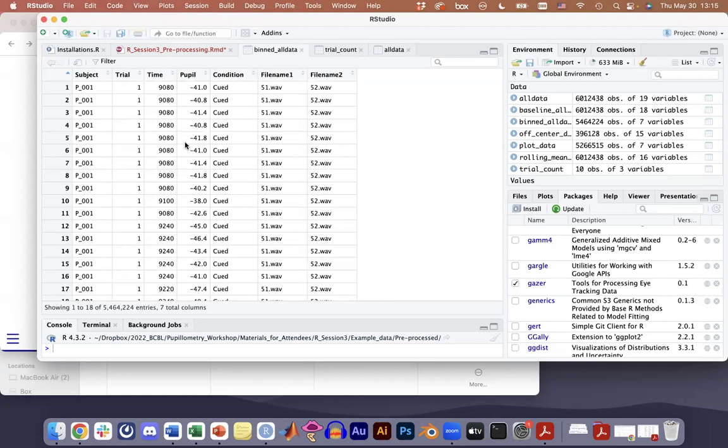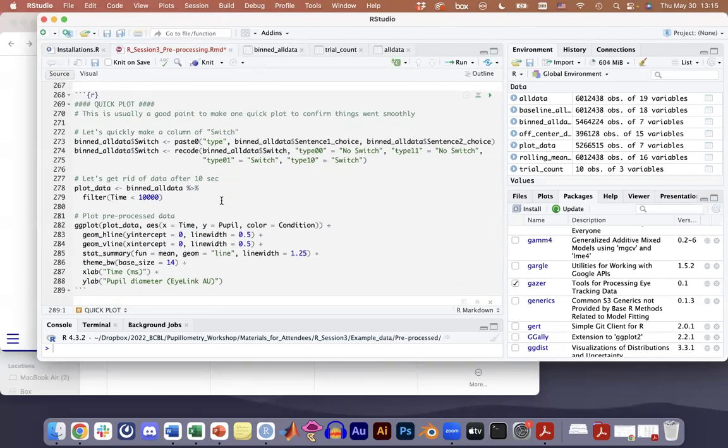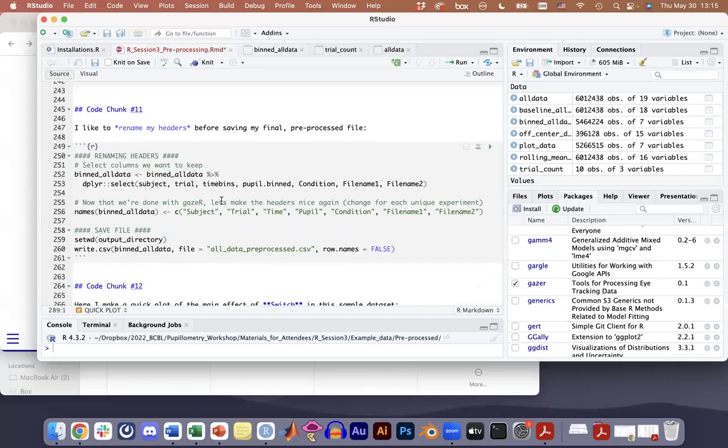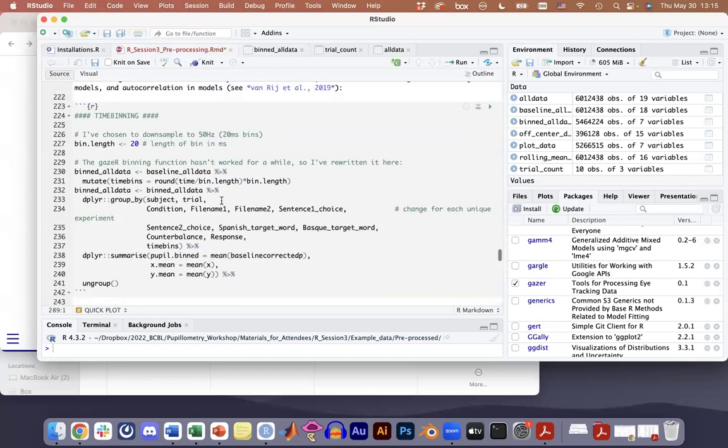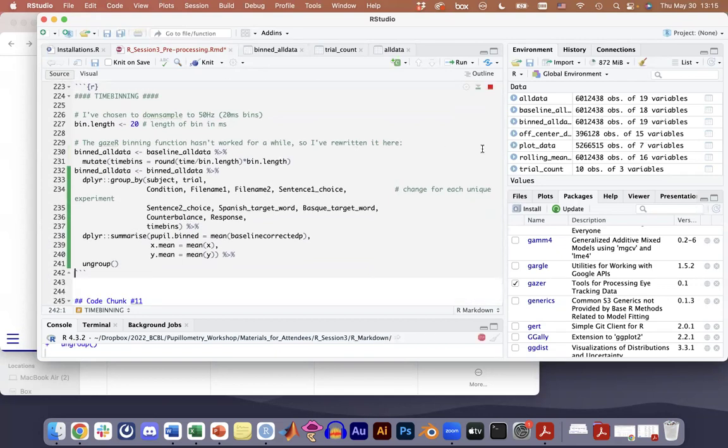An excellent point. Yeah, I didn't do it right. Oh, man. That might explain why things were being weird. Let me go back. Let me reprocess the binned data.